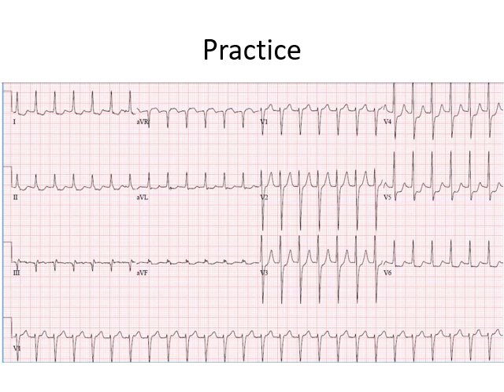Alright, so I'll approach this ECG from the very basics. First of all, I would like to look at the rate. If you consider this as the first QRS complex, this would be 300 and this would be 150. So heart rate is close to 150, which tells us that it's a tachycardia. Now we are not able to see any P waves.